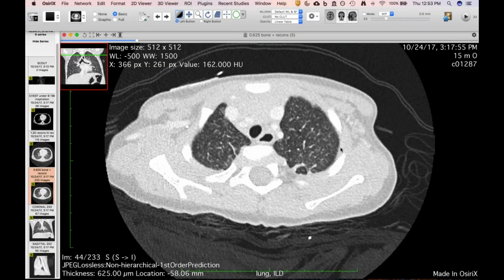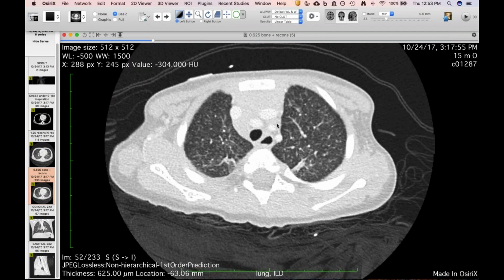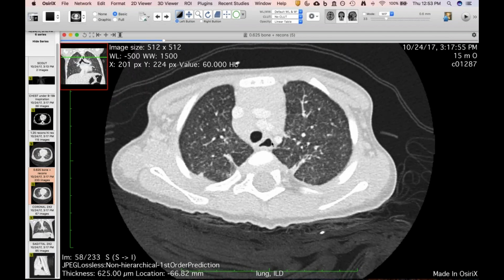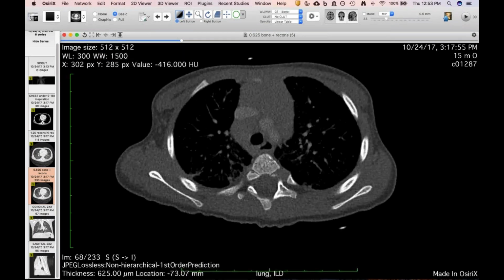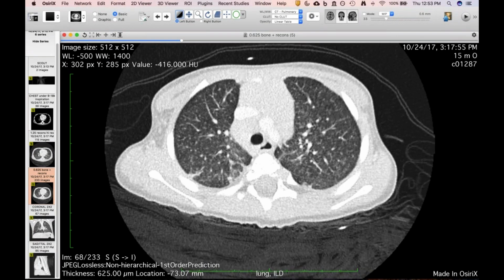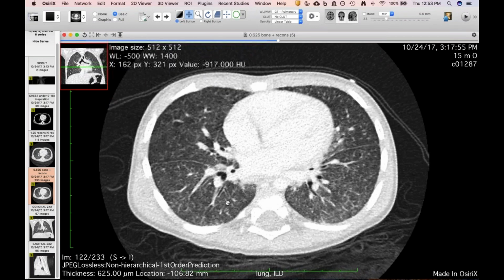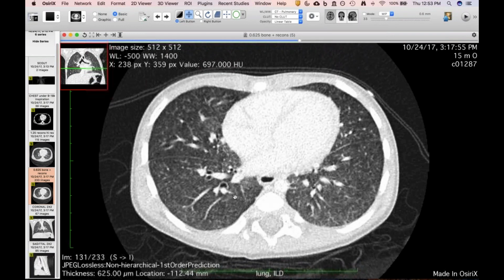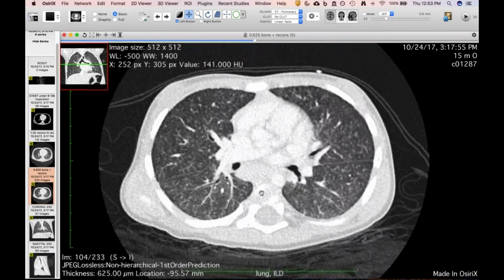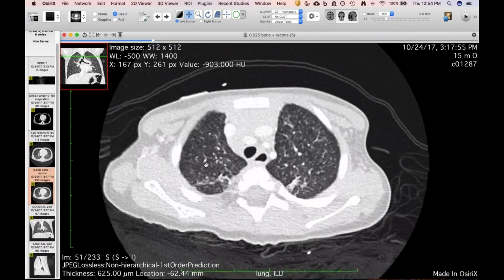And this is a 15-month-old, and this was identified through a family. They had a family member that also had it. But Jeff, I was not able to look at everything you were showing in your case, but I think it looked kind of like this in the young patient, right? It did start off as diffuse nodules like this, because this was biopsied and it was more follicular bronchiolitis at this time. There were the diffuse nodules. There was already some fibrosis and cyst.